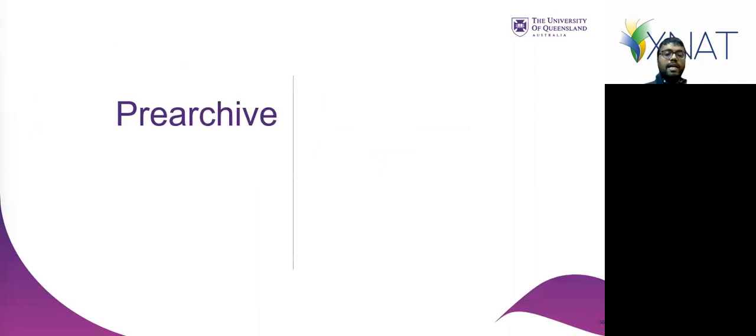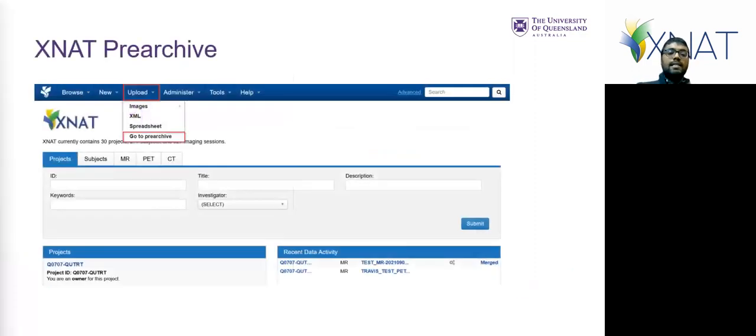So that's actually a good lead up to the pre-archive. That's one of the functions of what's called the XNAT pre-archive. If a data set gets sent with invalid project information, or if a DICOM data set gets sent, for instance, twice, or a partial data set gets sent and then a more complete one gets sent later within over a 1 hour window, it will cause a data set collision. This doesn't stop the pipeline. All that happens is XNAT triages it into what's called its pre-archive. So if you're expecting a data set to have arrived and it has not, it's most likely in the XNAT pre-archive.